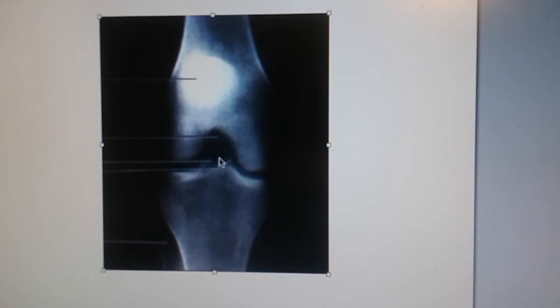But you want to see that intercondylar eminence is centered. This projection is actually looking at the tubercles on the top of the intercondylar eminence for ACL and PCL tears. Those little tubercles will pop off and there'll be little floaters up in here if that has happened.